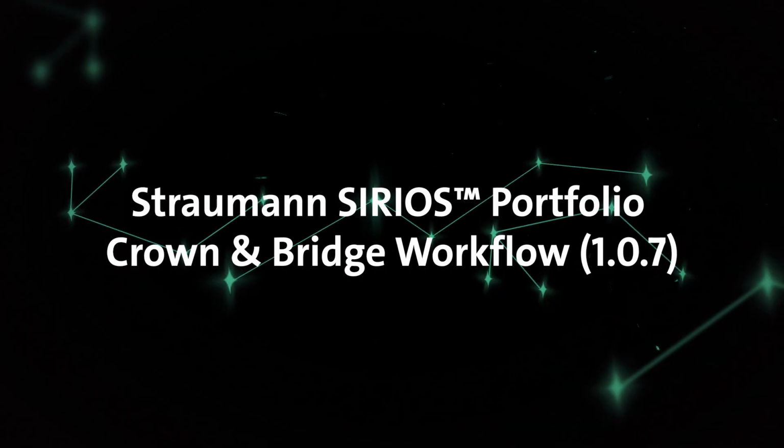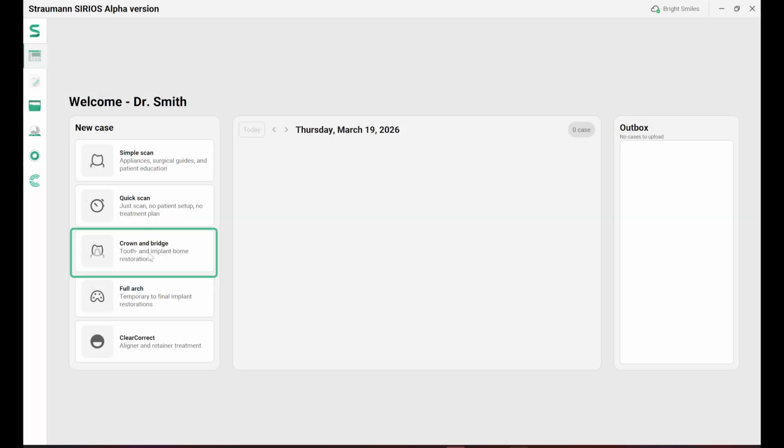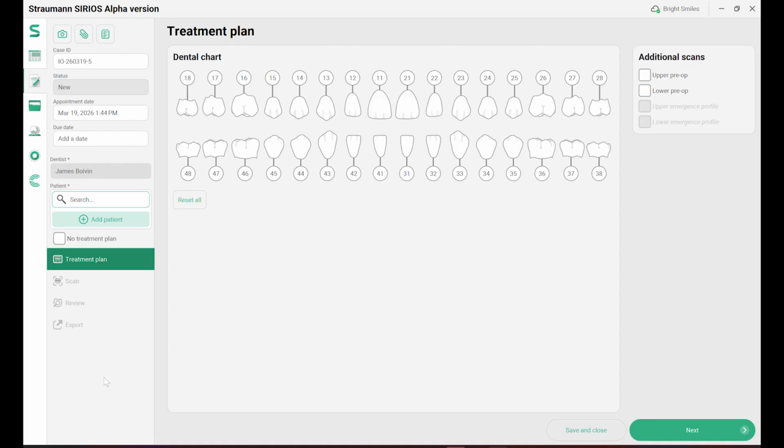Straumann SIRIOS Portfolio Crown and Bridge Workflow. Select Crown and Bridge to create a new crown case.